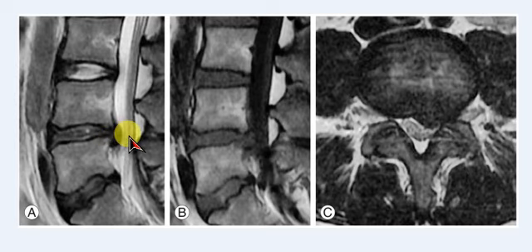These are just nerves, and it can just compress the nerves. So this is not a very serious concern in terms of serious problems, because the spinal cord lies above, so your patient does not get into spinal cord compression, but the problem will remain for the compression of the nerves.